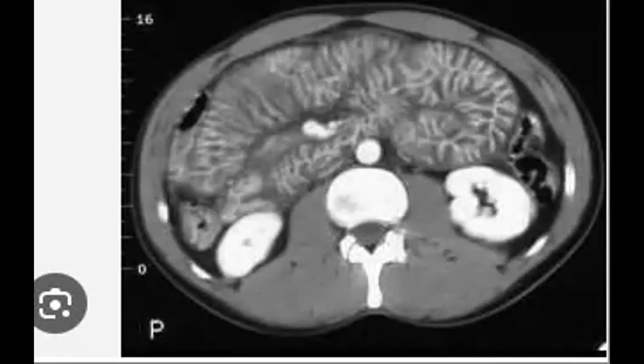So we're talking about something very important in the exam, called the shock bowel features. As you see in this image, he might give you a case and talk about features with thick enhancing bowel loops, and you might note that this enhancement usually is in the mucosa, and this is very characteristic to see in the shock bowel syndrome or shock bowel disease.